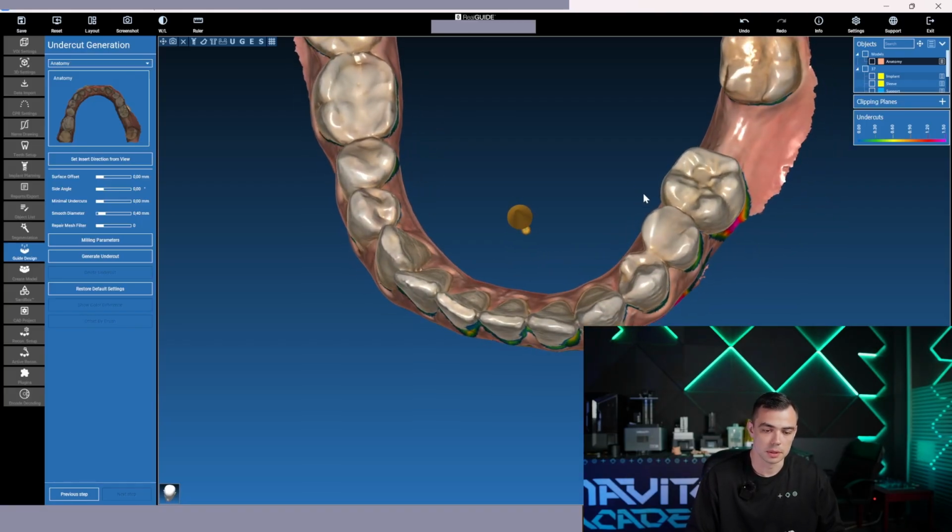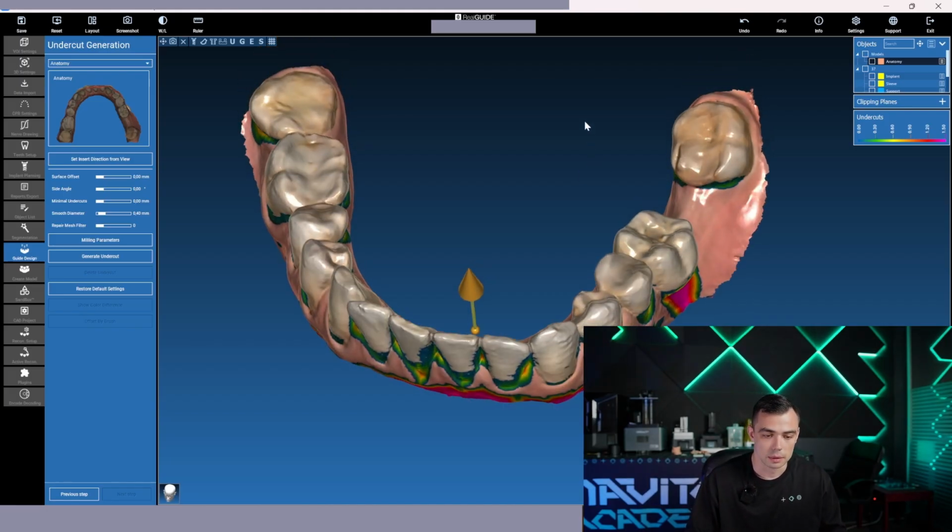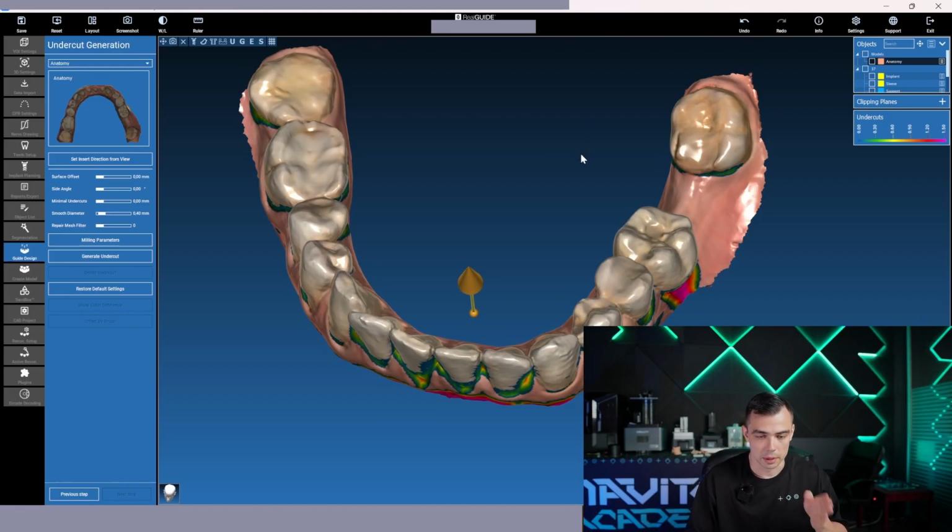Therefore, when we make a guide, we will just press it on the teeth, because it will be teeth supported, and we have to make the guide in such a way that while pressing it, it will not play on the teeth and will not go anywhere. It will be fixed very, very strongly, and therefore everything begins from this step.